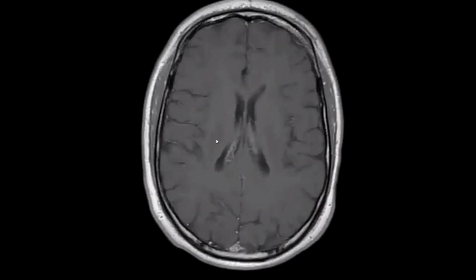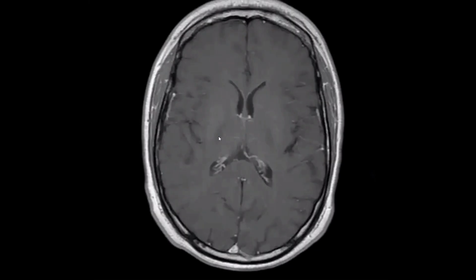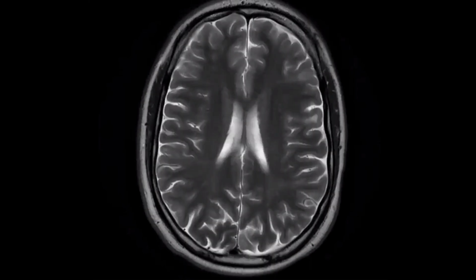Okay, very nice. Also check the lungs and do an abdominal ultrasound. So you are searching for any manifestations of the disease. I think annual follow-up MRI is needed to look for any developing giant cell astrocytoma. Follow-up is very important to check development of giant cell astrocytoma along the foramen of Monroe.